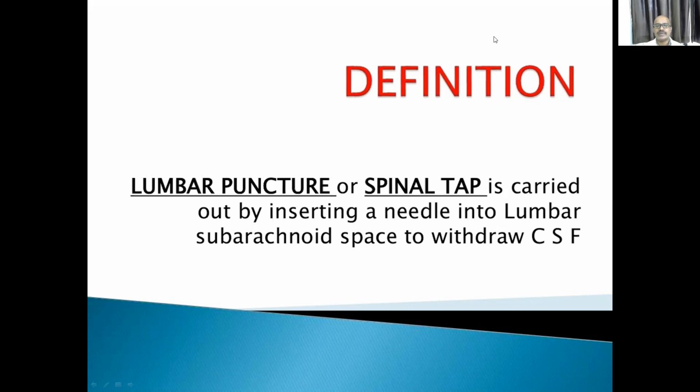Today I will be talking about two instruments: lumbar puncture needle and liver biopsy. These two needles may be kept as spotters. You have to identify the needles and write 2 points so that you can get your marks. You have to identify there are 3 needles.